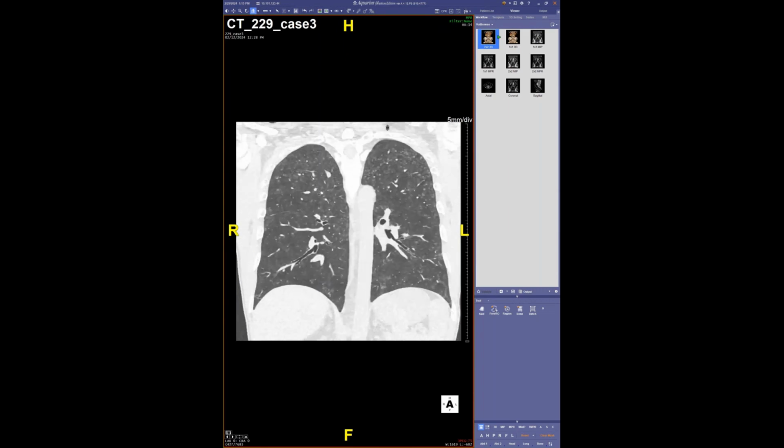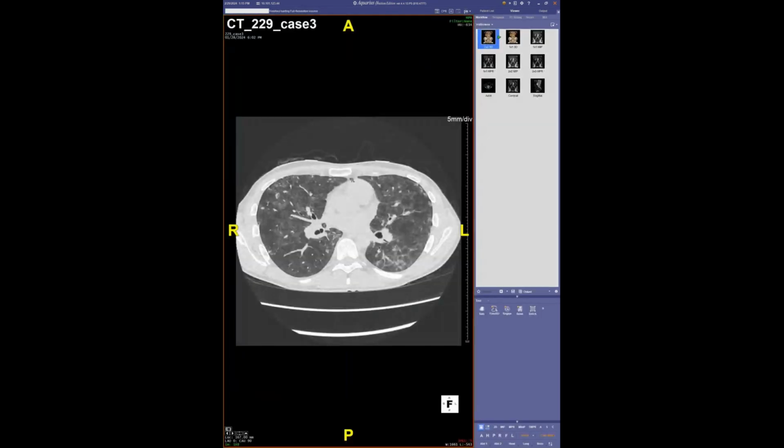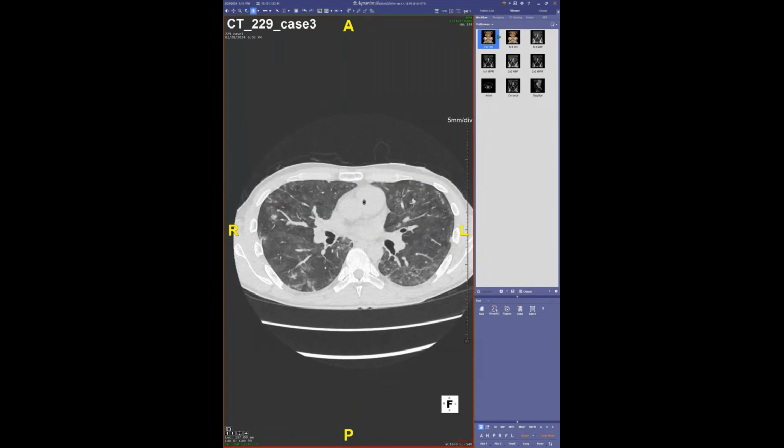We do still see cases, not as frequent. So I said it could be HP, something else inhalational. It doesn't look like regular smoking stuff. It's too extensive. So we got the outside study, which was actually also done just down the road at UC. And here he was 2 weeks before.